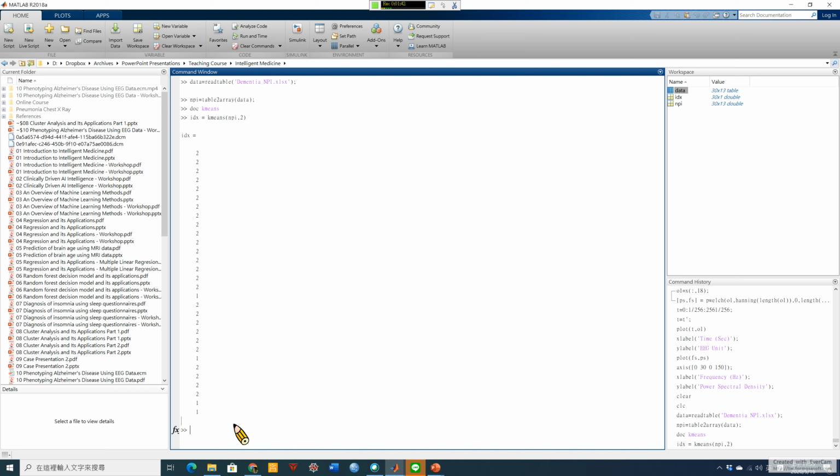So remember that in the previous course I showed you that the location of the initial centroid is very important, because those random locations will have a significant influence on the final result. For example, here I just show you that you can type this command again. You can see that the result is totally different from the first round.